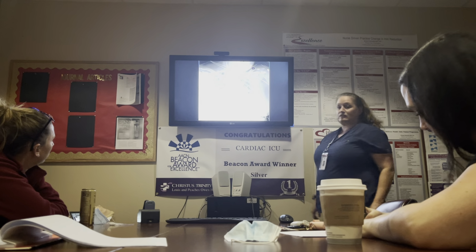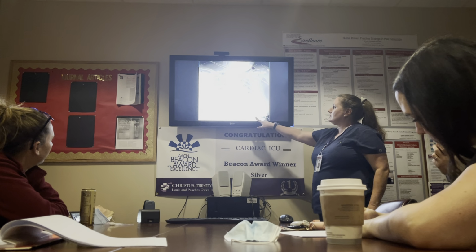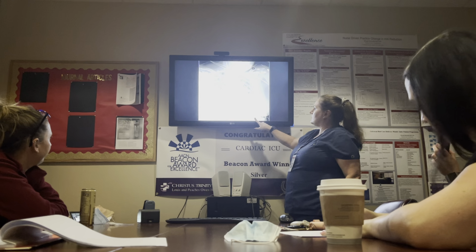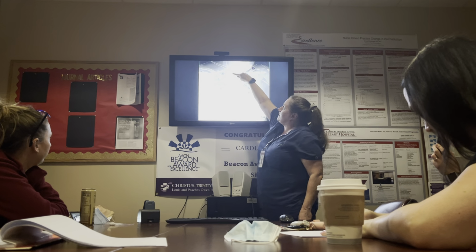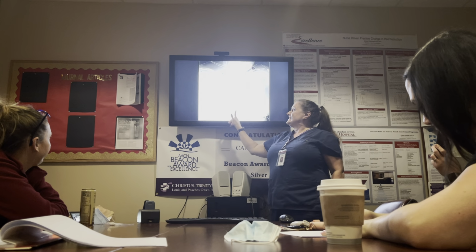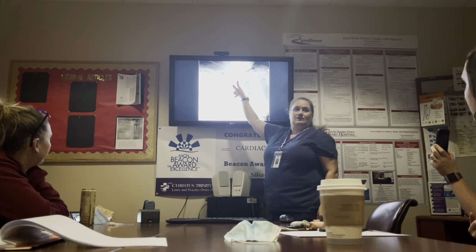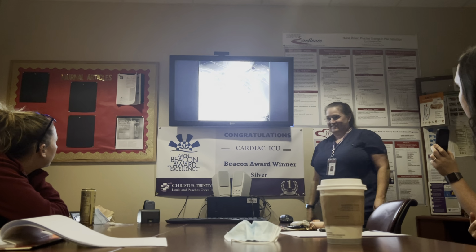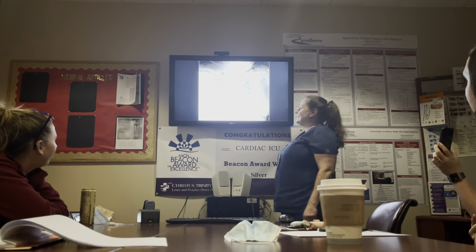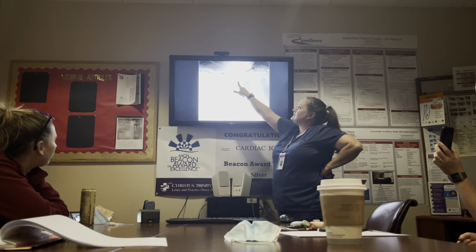All right, some devices that you're gonna see. Okay, so this is outside of the chest. This is probably pacer wires or something along those lines, right? That's kind of what that looks like. So you've got an endotracheal tube, you've got a Cordis. What's that? Swan, okay. What's this? Balloon pump. That's your balloon pump. Got some chest tubes, okay?